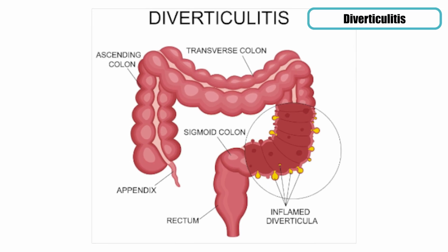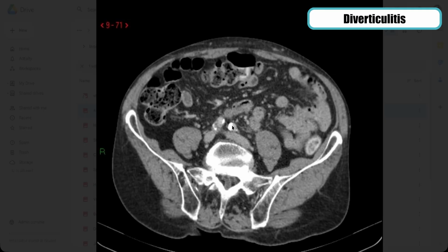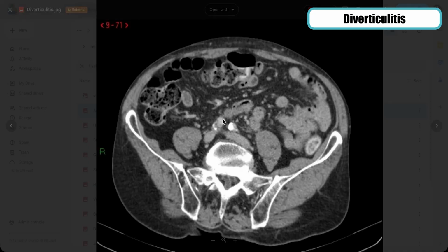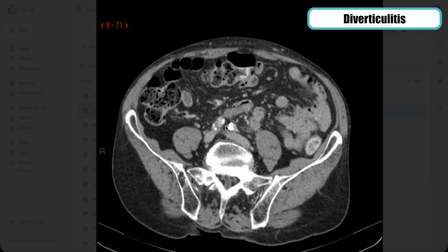That's diverticulitis. If you walk yourself anteriorly here towards the top of the image, you'll see some calcifications in here. This could be some atherosclerosis of some vessels, but if you keep going, you'll see a bunch of little dark spots, a little speckling, lucency throughout a lot of what would be the intestines, kind of all over the place. These small little dark patches are diverticulum.